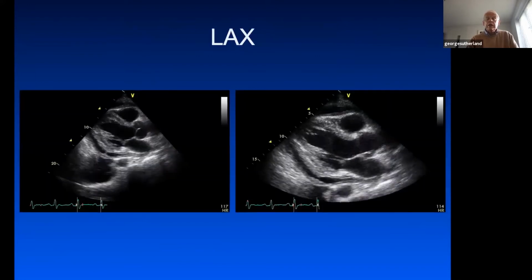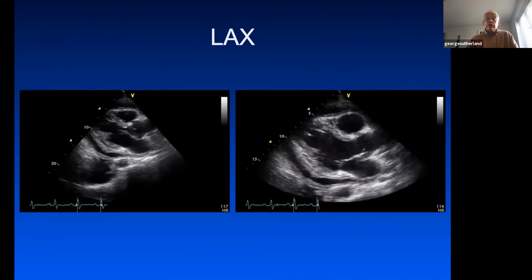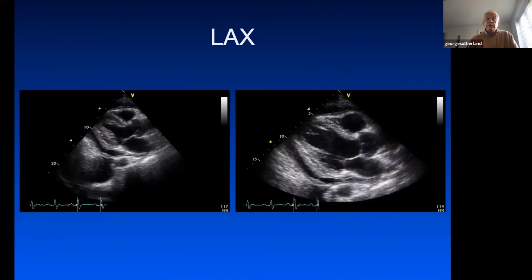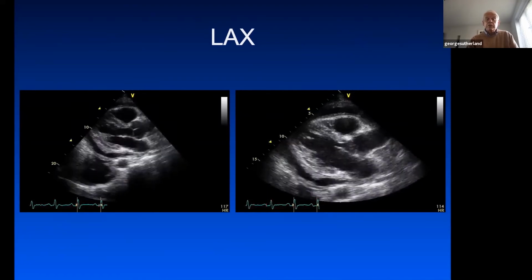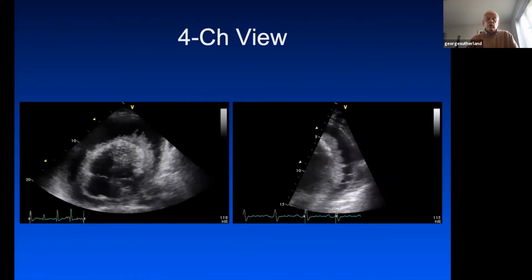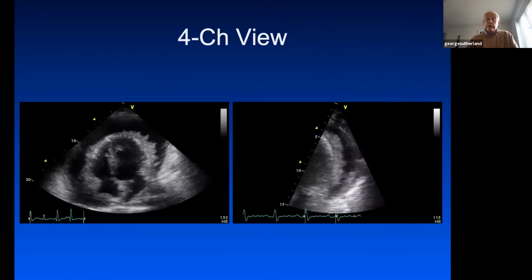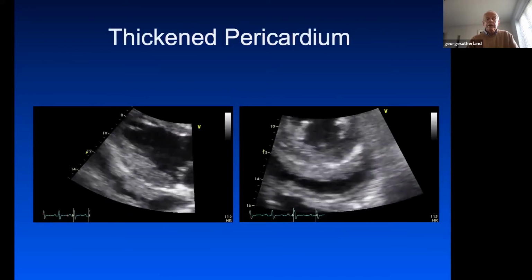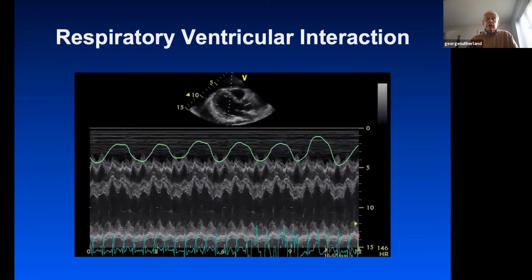I'd just like to start very briefly with a case, a 34-year-old Asian male being breathless and developing ankle swelling. And all of us, I think, would have no hesitation in making the diagnosis. We can see here there is thickened pericardium, both visceral and parietal. There is abnormal motion of the septum. And when we look at the walls, we can see a fibrinous exudate into the pericardial effusion. I think we all can guess that this is acute, ongoing tuberculous pericarditis.